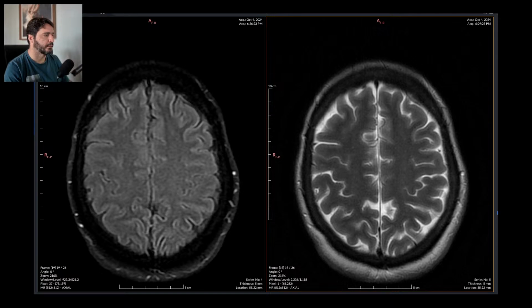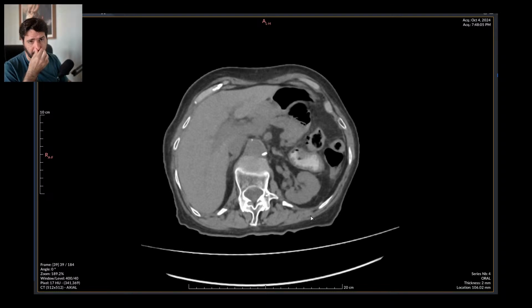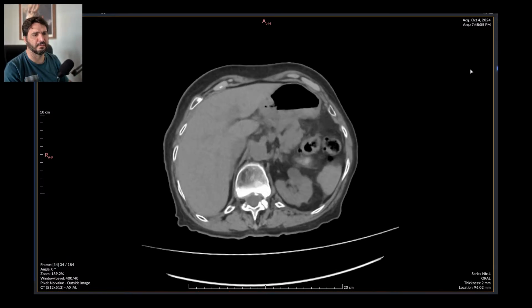Yes, that is an exam from yesterday that they are asking me to see if there are signs of obstructive bowel disease, and I have already reported this scan yesterday, and they did some stupid oral contrast sequence on a 91-year-old female. That makes no sense.